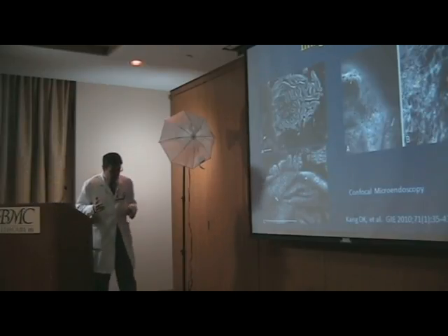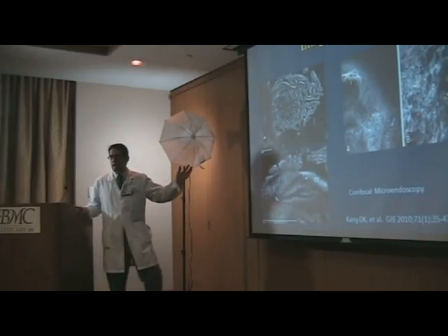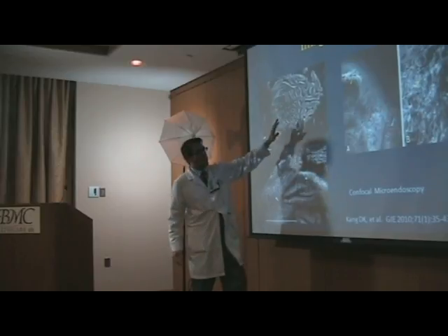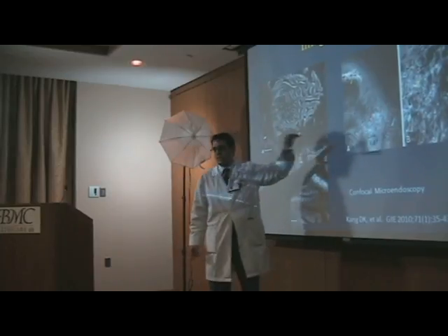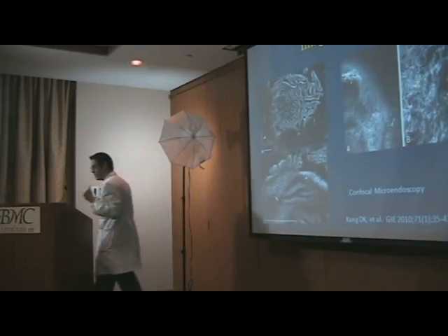And again, those of you who have never looked at a slide under a microscope can still tell me that this looks very organized and very nice and neat, whereas this doesn't look neat. It looks very disarrayed and very disorganized. So that is actually an example of an esophageal cancer.